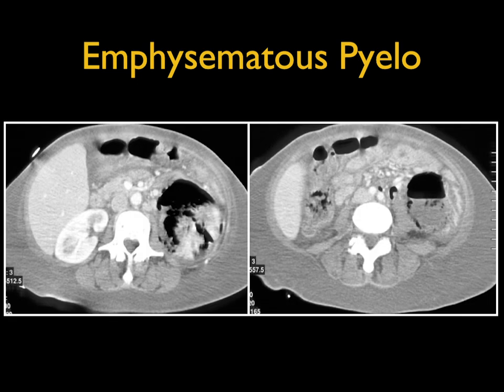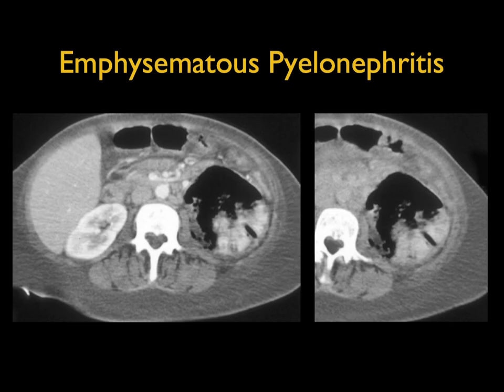Another example, looking exactly the same. Look at the left kidney. That kidney is basically destroyed. There's some minimal enhancement, I don't know from what, but the rest of the kidney is all air. It's basically gone. So it's a very important diagnosis.